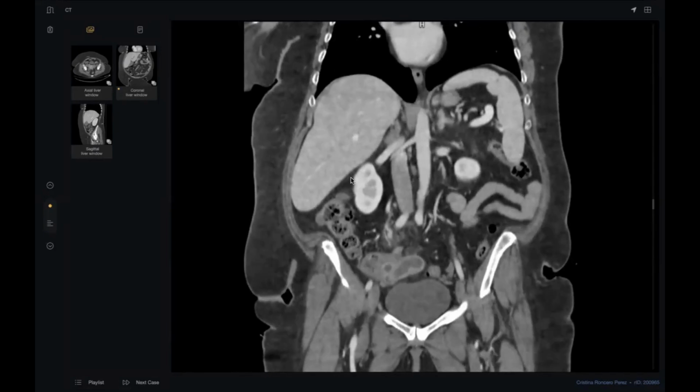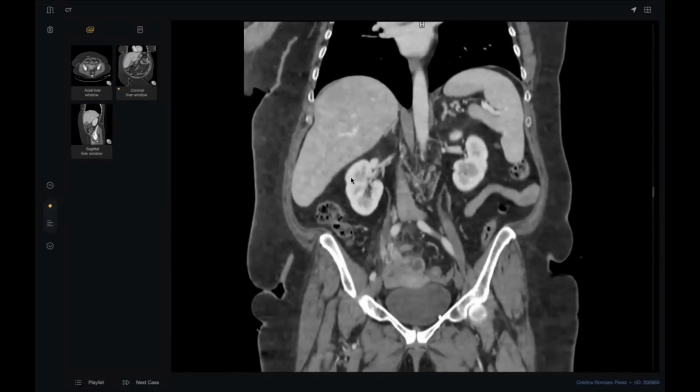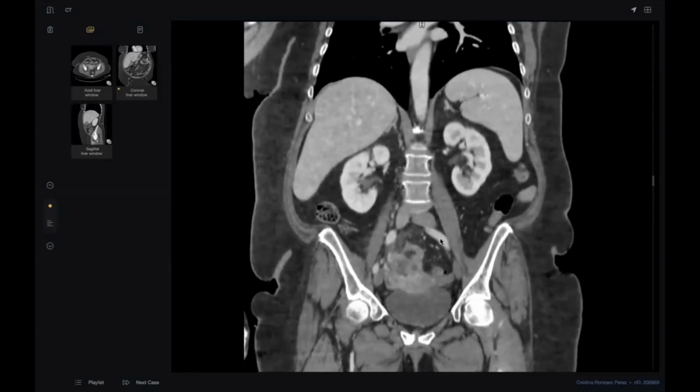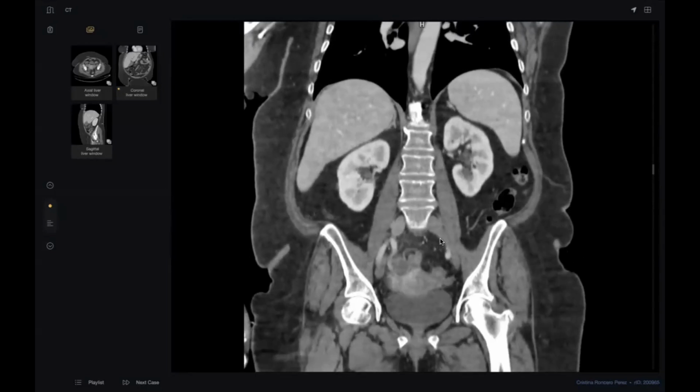Okay. See here. What is this? This. Where? This. Sorry, I can't see your cursor. What is this? Look, concentrate with this. Oh, this is a vein. This is a thrombosis in the vein, I think. Thrombosed vein, right? Again.